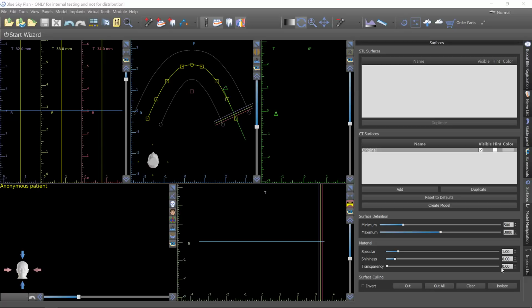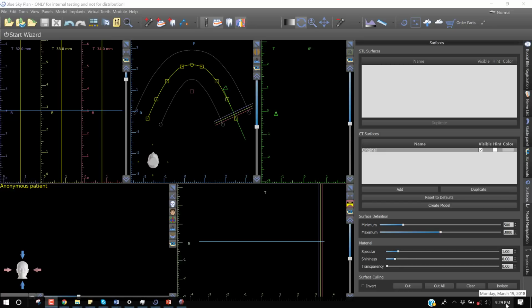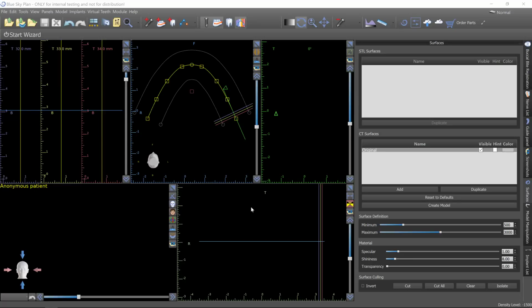Alright, this is Dr. Corey Glenn, and I'm going to be doing a video taking you through the beta soft version of the Denture software. This is just the newest version of Blue Sky Plan. Depending on how far in the future you're watching this, today's date is March 19th. This is the very first public release, and it's purely in its beta form.